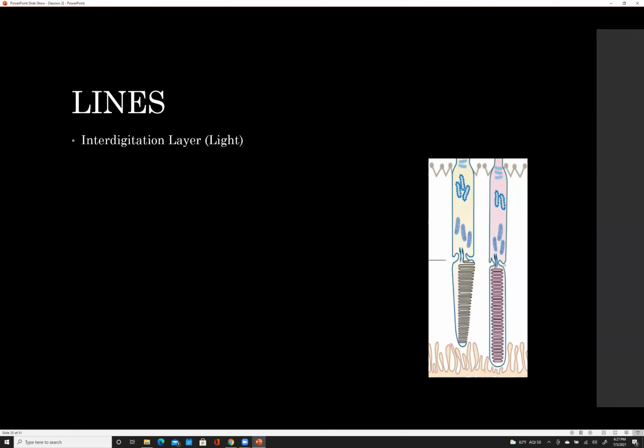Then we get to the interdigitation layer. The interdigitation layer is down here, and it's basically where the RPE's, I don't want to use this word, so I'm going to use first the words apical processes. That's what they call them, apical processes. But I actually call them fimbriae, right? Because they're like fingers coming out, and they're almost like seaweed where you interdigitate, and by definition, they're trying to fill the gaps, because they're dealing with the shed discs and recycling them. So they've got to be as close as possible to the tips of these.